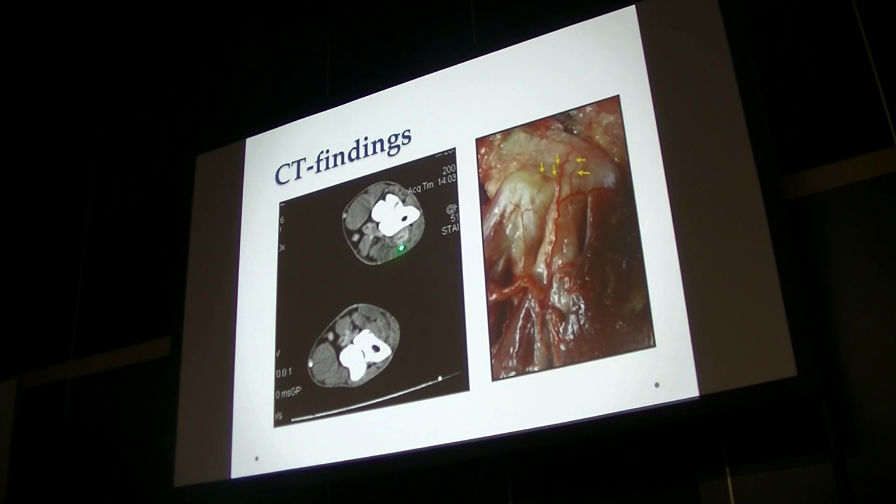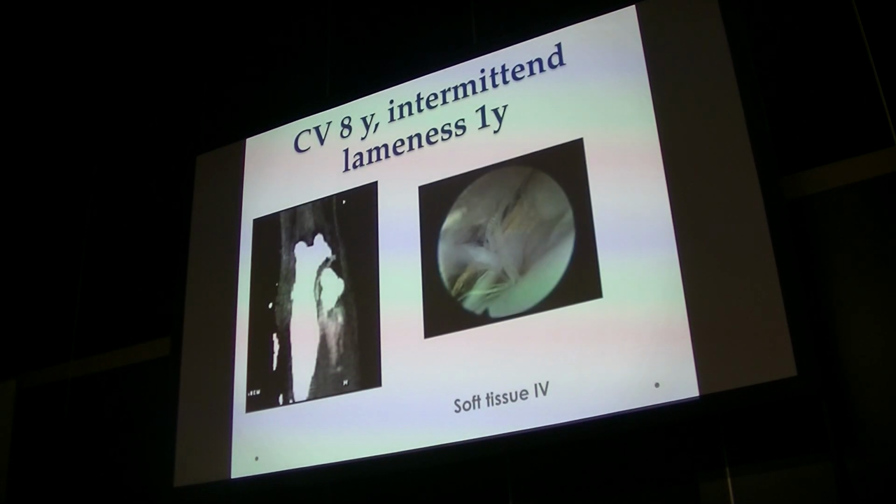You see here the enhancement of an affected elbow. Why do we see some contrast here? Because this was an anatomical detail of the attachment of the flexor tendons. There is vascularization at that level. It's not that there are no blood vessels. You see some blood vessels which are normal and present in a normal attachment. So some enhancement will be visible after IV contrast, but these ones, and it can be even more discreet and even worse, the uptake of really inflamed flexor tendons.